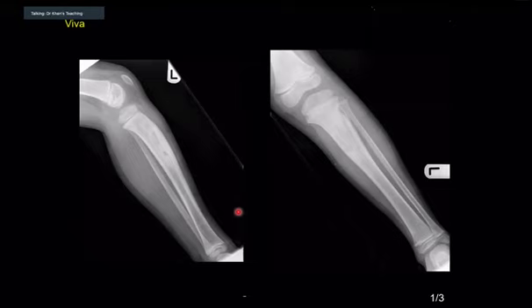Now, if you stretch your imagination slightly and see carefully, in the real world you will be on a DICOM viewer, and you can play around with your densities. But do you see this? Look at the configuration. Isn't it linear? Yeah. So what comes to your mind? So it can't be an LCH. Right. Very good. It's more like, yes, infection.